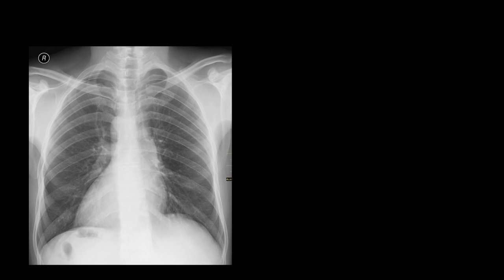Before moving on to the mediastinum and hila, I want to briefly mention a congenital anomaly, which, although it's relatively rare, tends to be mentioned during rounds or on tests out of proportion to its prevalence. At first, you might assume this X-ray was loaded into the system backwards, if it wasn't for the capital R in the upper corner, indicating that in fact the X-ray is in the correct orientation.